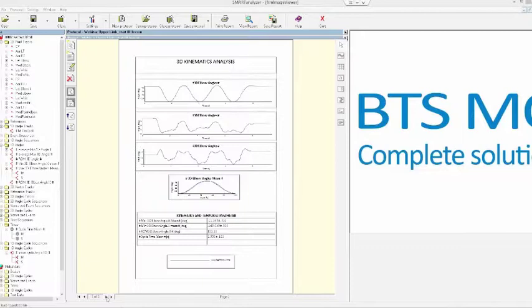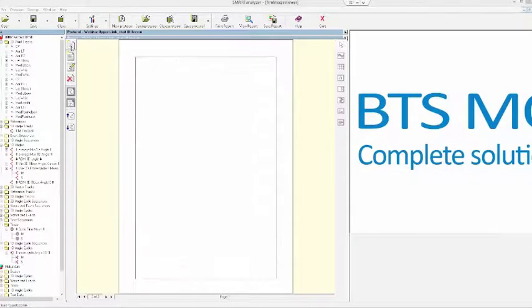Okay, and now I want to add the last page, which you can imagine will contain the average information. So imagine the case that we will load more than one trial to our protocol, and I want to add here all the average values that we have computed.